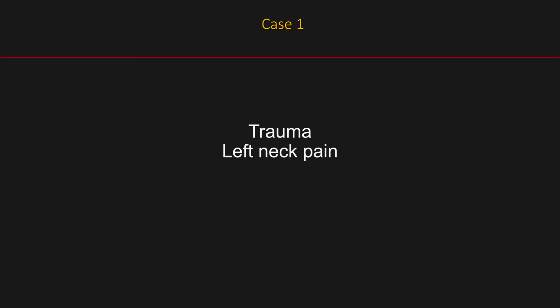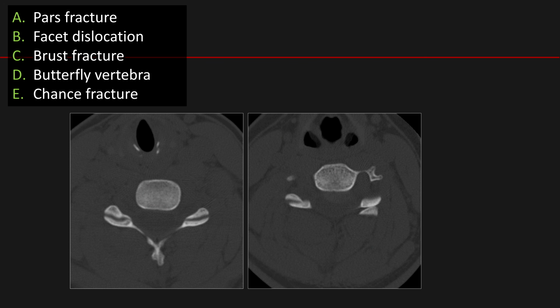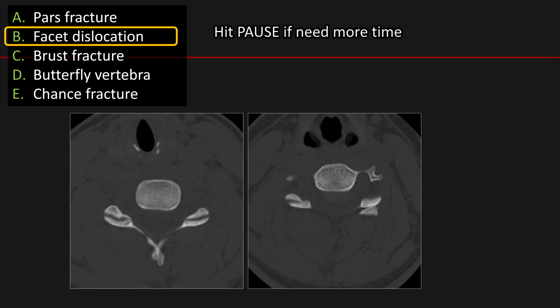Case 1 is trauma. The answer is B. Case 2.